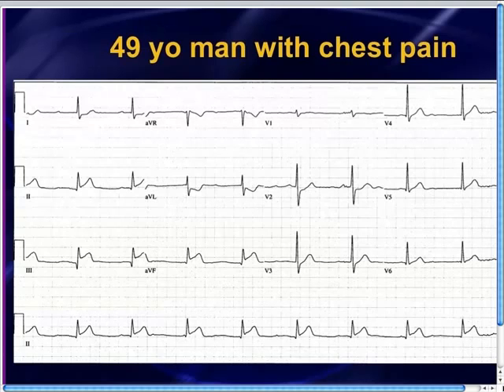So first, in terms of the ischemic findings, hopefully this is kind of a no-brainer for everybody out there. You're noticing that this patient's having an inferior wall STEMI. So no big surprise there. There's ST segment elevation in the inferior leads. It already looks like the patient's starting to develop some Q waves in some of the inferior leads, maybe a little hint in lead 2 and AVF, but lead 3 clearly already starting to Q out. So it's probably the first few hours of this infarction.